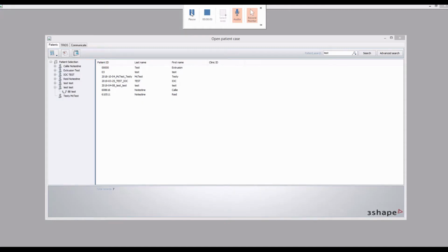So in the previous slide video, we went through the bracket placement module. And remember, you have to validate those. If you don't, it will ask you, but make sure they're validated. You're going to close out of Ortho Analyzer and go into Appliance Designer.